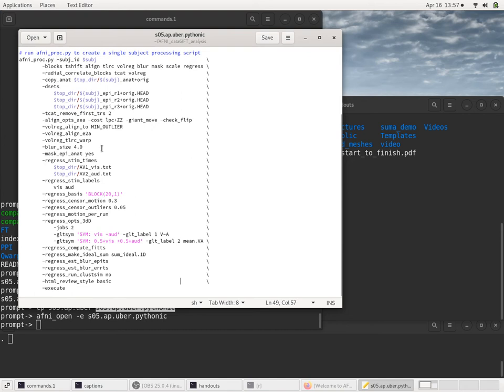And here's the full AFNI proc script. And now the question is, how does this compare to a different one? There are multiple ways to compare it, but let me start by comparing it with some of the AFNI proc options. In particular, one of our common ones that we suggest as a possible example for task analysis is example 6b.